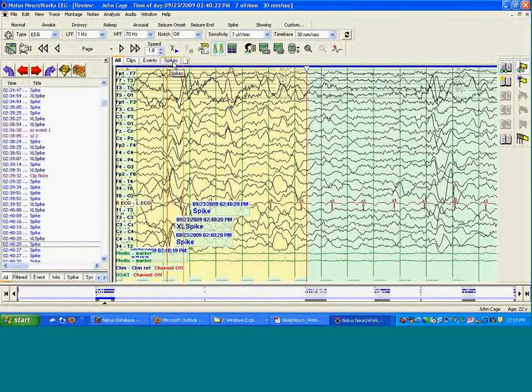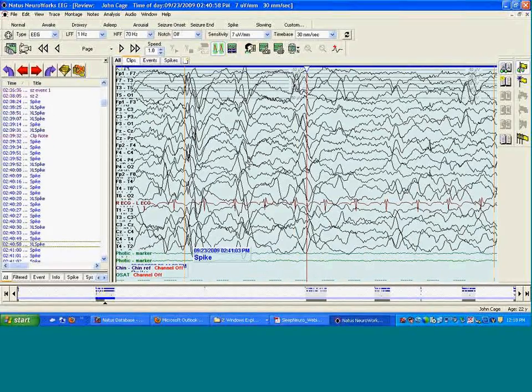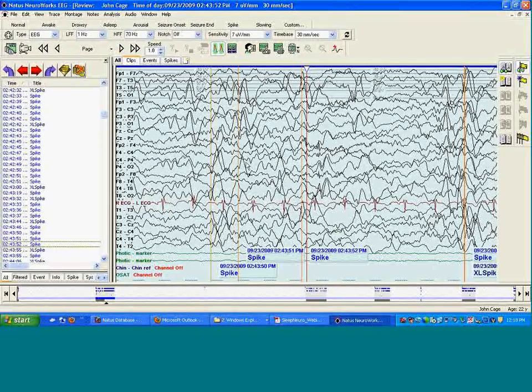So what this is intended to do is, if you don't want to create a separate prune study, if I clicked on Clips, for example, it'll take the 3 clips that I just created, glue them together, and display only those 3 clips under the Clips tab here. So if I were to scroll through this, it will display those 3 clips that I just created.